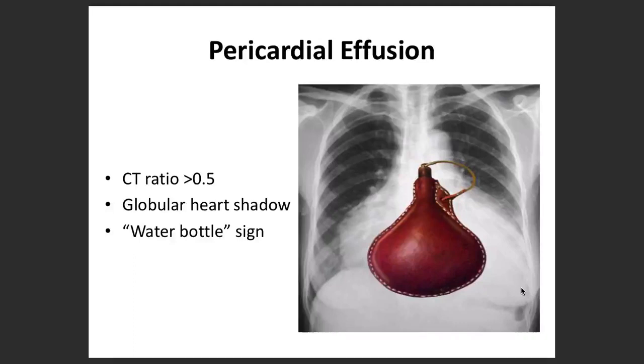So a water bottle is filled with water, right? So similarly, the pericardium is filled with water. That is what pericardial effusion, the water bottle sign, is.